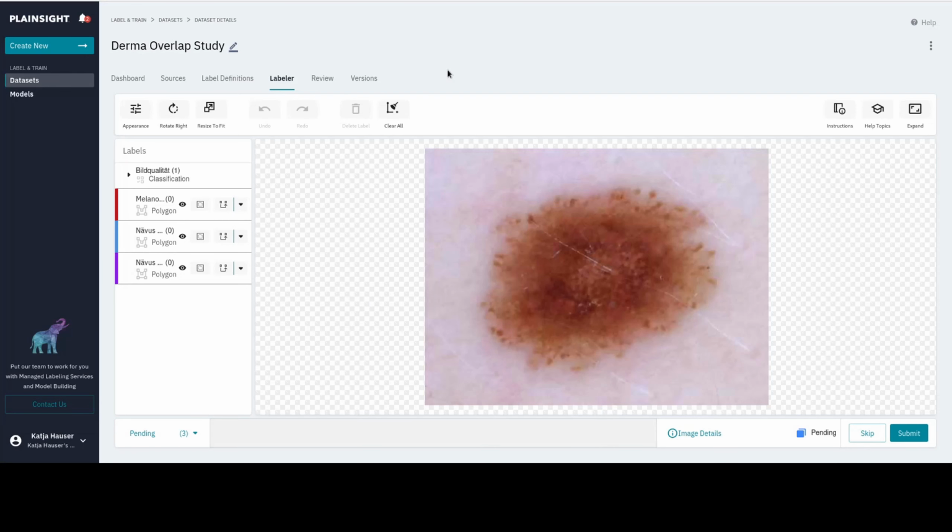Now we get to the annotations. What we need from you for each image is a diagnosis, annotations of the image areas relevant to the diagnosis, together with textual explanations that you'll select from the ontology, and a confidence in the diagnosis. I'll demonstrate this first with a very simple case, and then show you two more complicated cases.